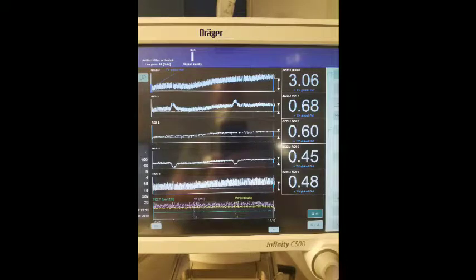This video is for healthcare professionals who are already proficient with the use of the electrical impedance tomography from Draeger PulmoVista. So I wanted to look at a little case that has occurred. It's something that all respiratory therapists or clinicians using the PulmoVista must know.